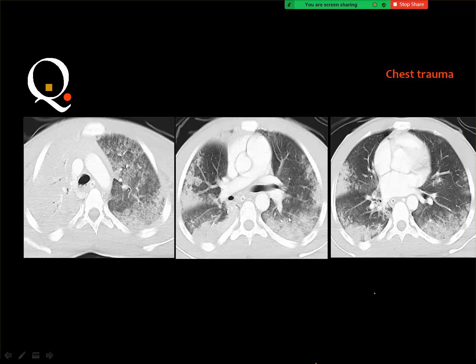Many times in the exams, they provide cases like this where you can notice a small rib fracture on the right or on the left. And they will not give you the history because the history is seen in the film. And if you are, let us say, intelligent enough, then you will see the rib fracture and you say that these are pulmonary contusions.